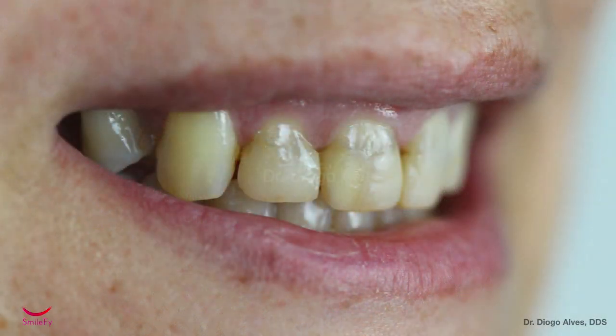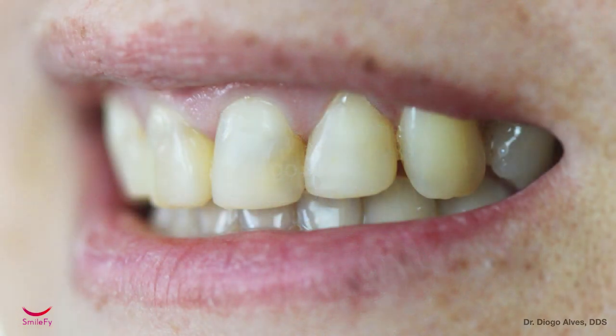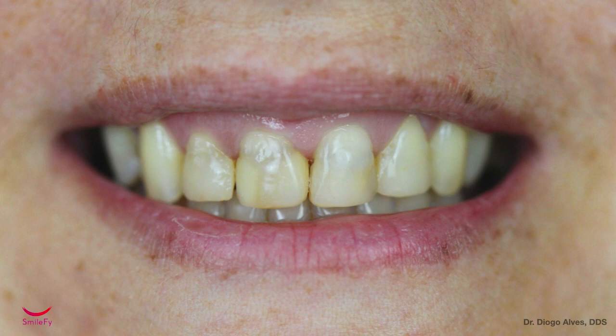An aesthetic analysis showed the necessity to reshape the teeth form, correct uneven gingival margin, and whiten the teeth by changing old composite restorations and replacing them with crowns and veneers. The patient requested to keep some of her gingival exposure to maintain the identity of her natural smile.